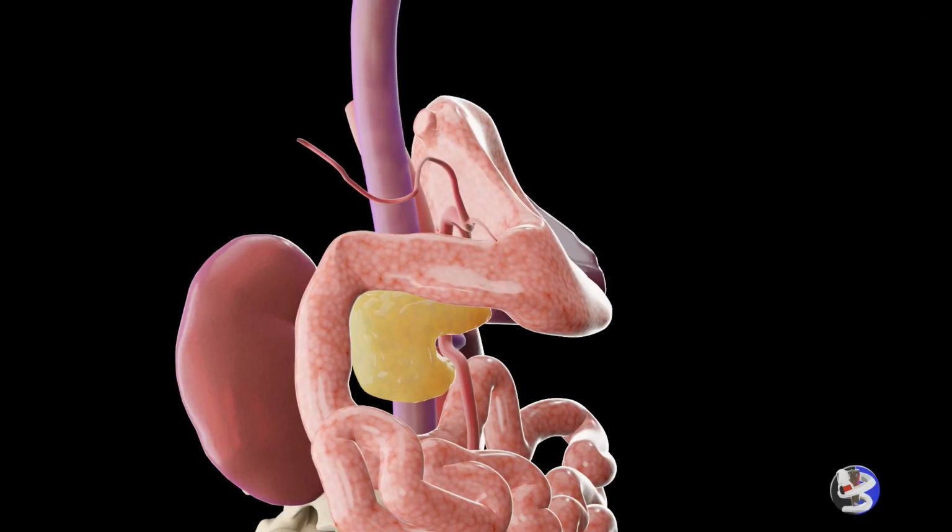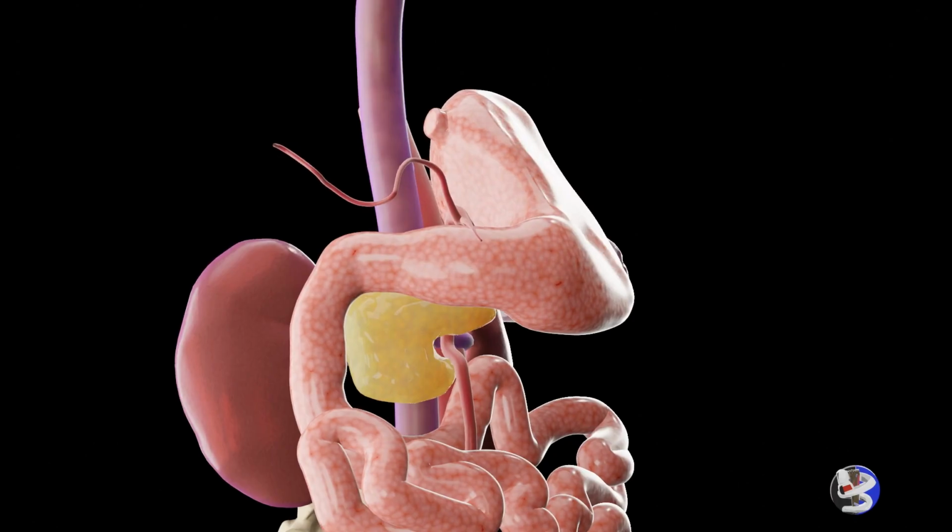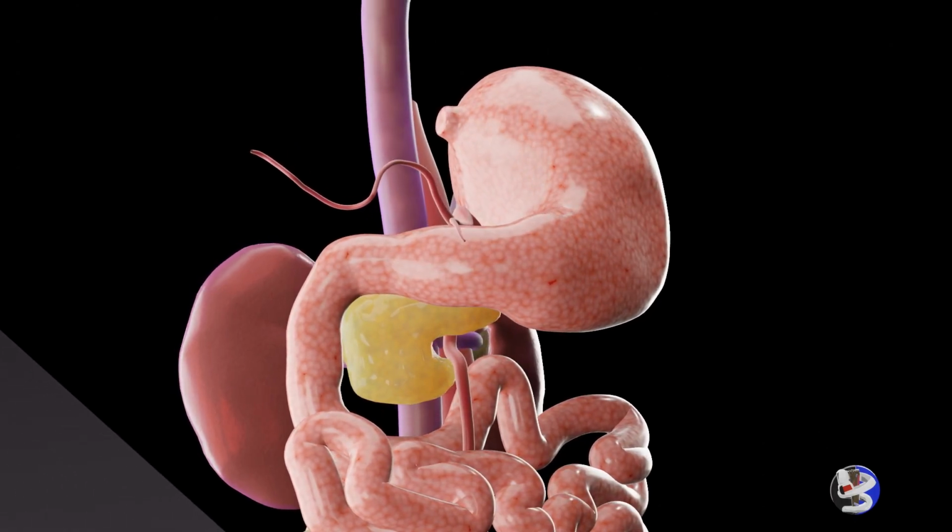The story of gastric ultrasound is the story of gastric content and aspiration risk assessment. In the beginning, the practice of anesthesia used to carry significant complications. Aspiration of gastric contents was responsible for a large proportion of anesthetic-related deaths. The fasting guidelines were developed to decrease aspiration risk, but have several limitations. Despite their use, pulmonary aspiration is associated with severe morbidity and death.